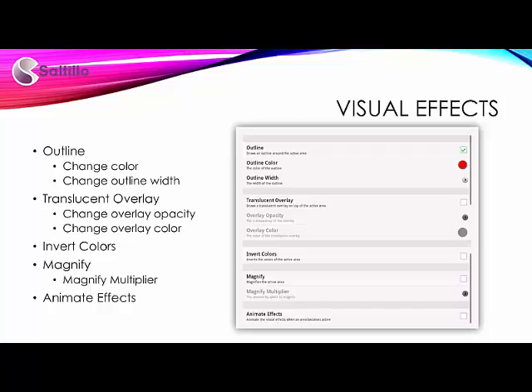Visual effects. Chat Software version 2.2 introduced some new visual effect options. These options can aid the user to see their options as they are scanned. The visual effects can be used individually or in combination. Note that visual effect options become available when scanning is enabled.